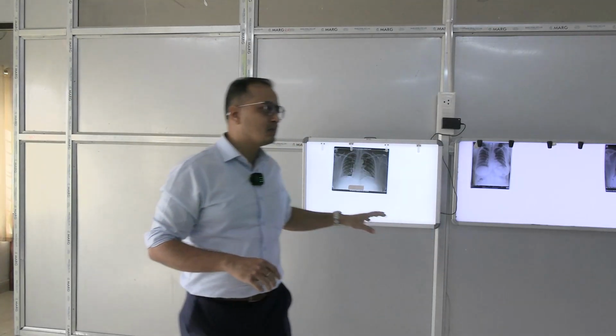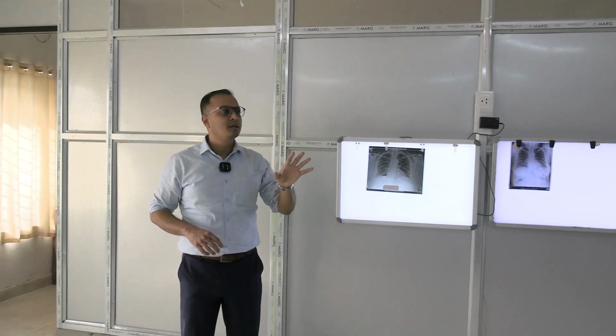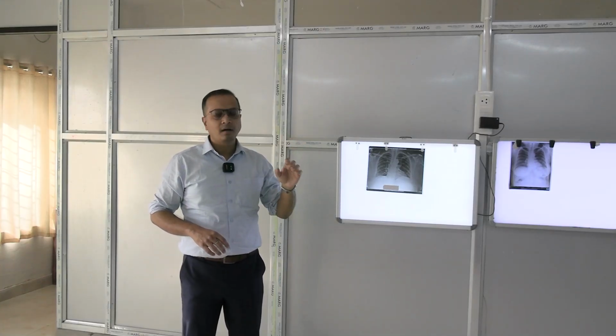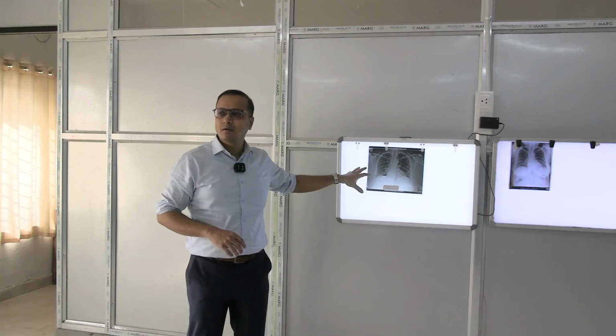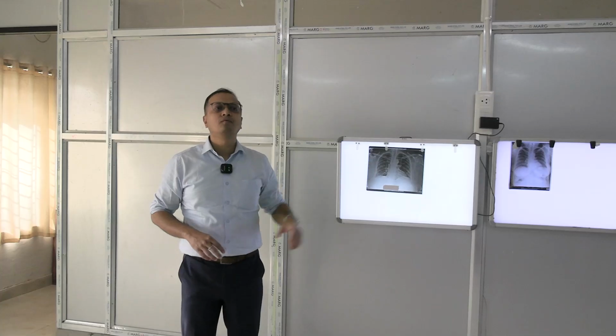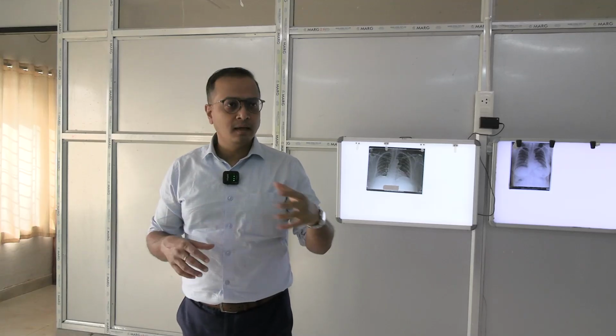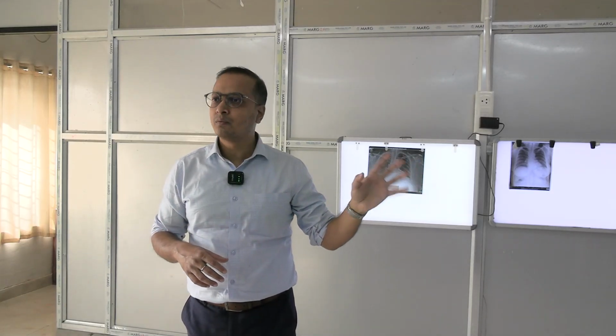These are the three possible views of human bodies. Normally, we ask you to understand and decode them, okay, right. So, out here, by default in the thorax, the views will be PA views, unless something special is mentioned. Unless we take otherwise, what is projected out here is the posterior anterior view or PA view of the thorax. So, whenever you are given this, the first thing to understand is whether it is general or plain or special. Then we have the views, how these particular views we are seeing here, whether anterior posterior view, lateral view, oblique view, etc. That is what you have to figure out.